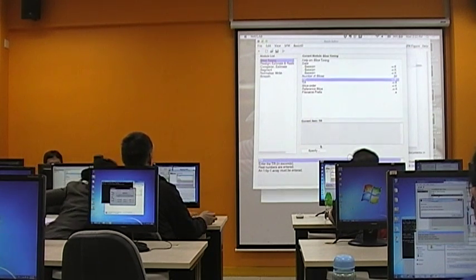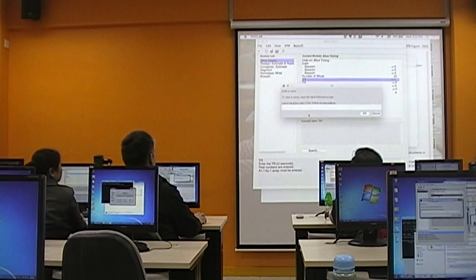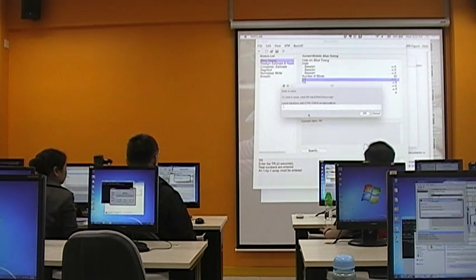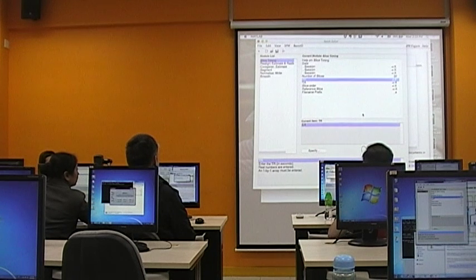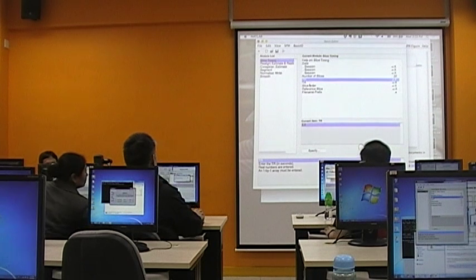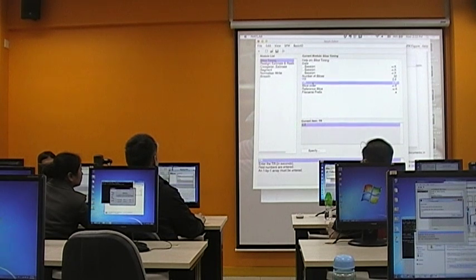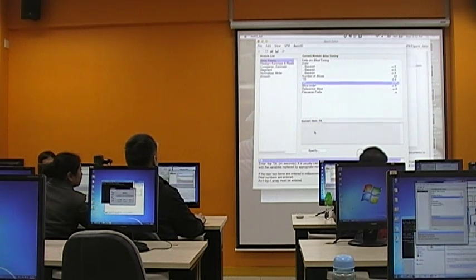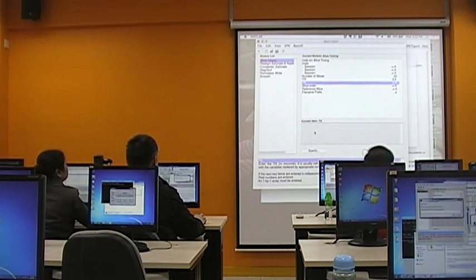And TR, again, you need to get this value from your MRI technician. In our case, we are using a TR of 2.6. You also need to remember this because when we set our first level model, we also need this information. With the number of slices and TR, you can calculate the TA, which means the time of acquisition: the time required to acquire 1 brain volume. Not 1 slice, but 1 brain volume.